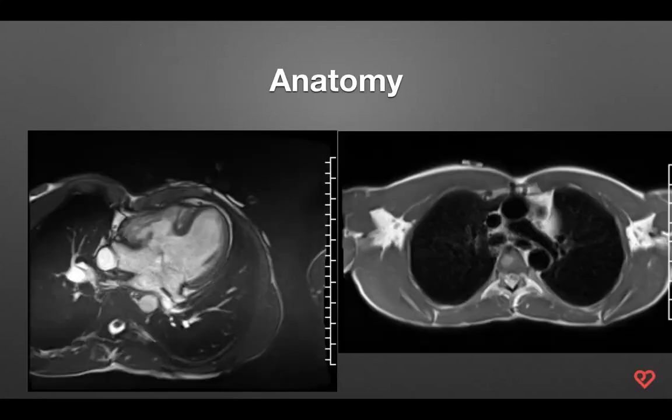I'm going to point your eyes to the picture on the right first, and what I want you to notice is that the aorta is anterior in this individual compared to the PA. So this is the malposition that we're talking about. Generally, in normal hearts, the PA is anterior to the aorta. So this is once again the aorta, ascending and descending.